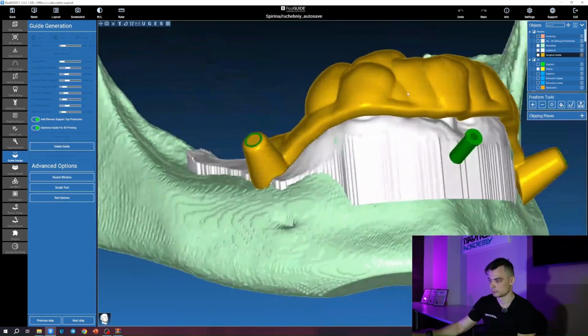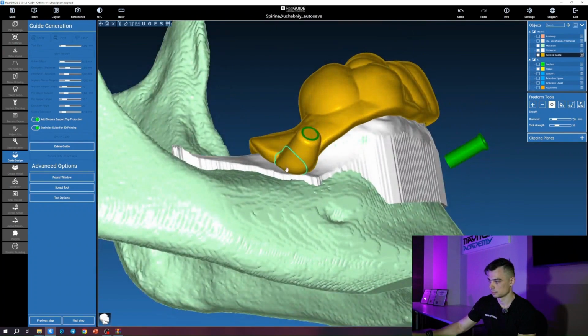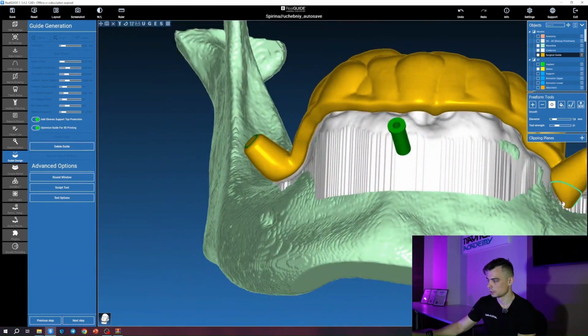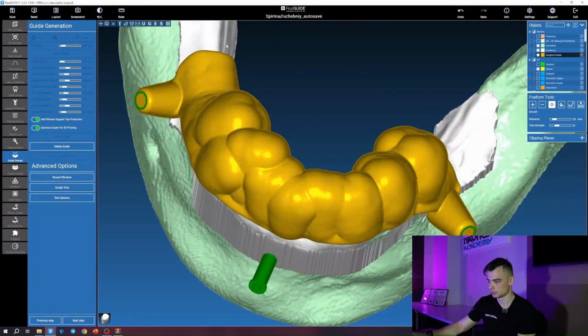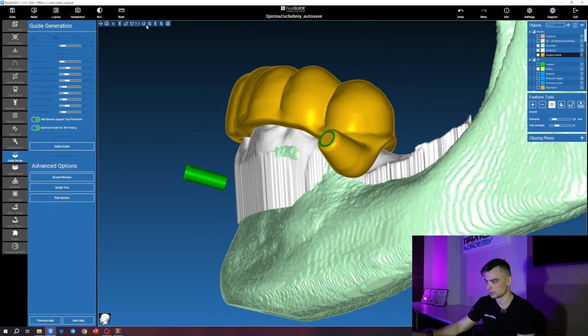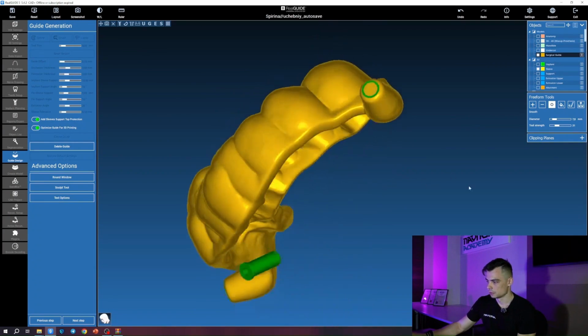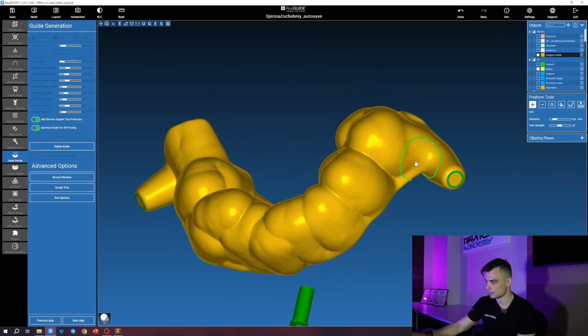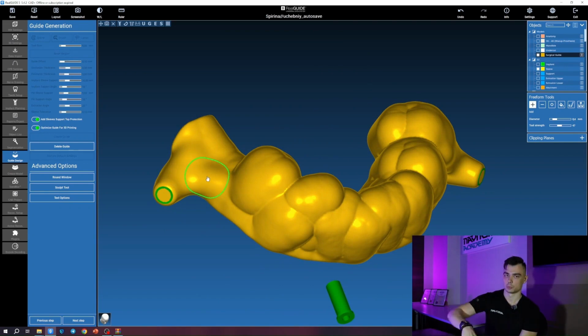And we see that we didn't include all the implants in the design that we had turned off, and the pin wasn't included either. Accordingly, we smooth out this part, we smooth everything out, remove everything unnecessary, we reinforce the pin in the necessary areas. And the necessary areas are the transition points of any sleeve to the main body of the template.